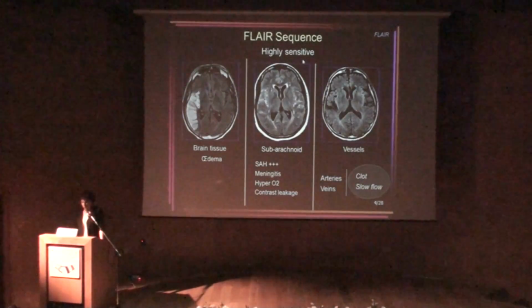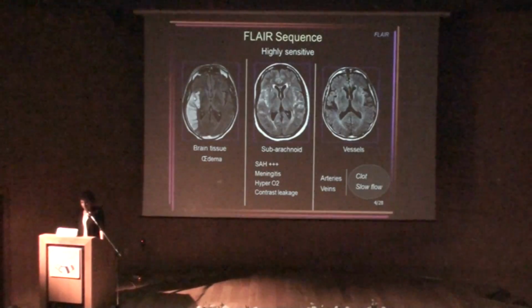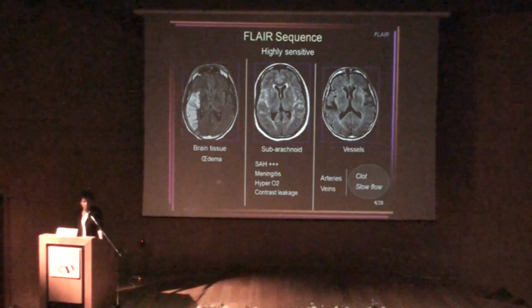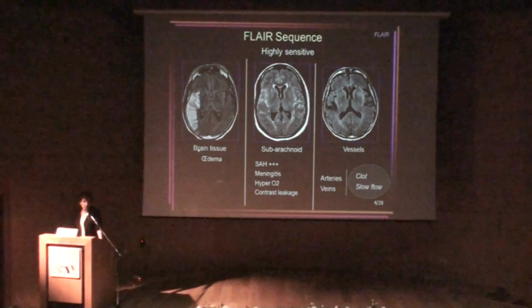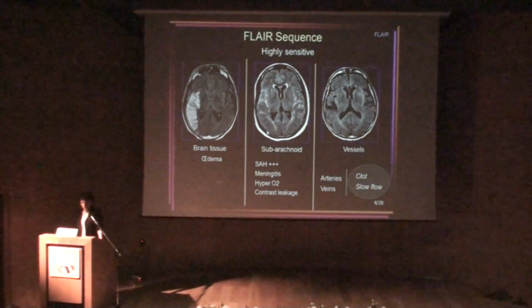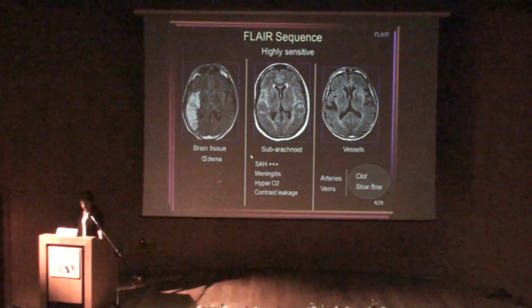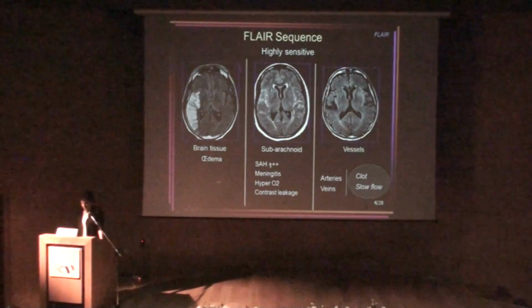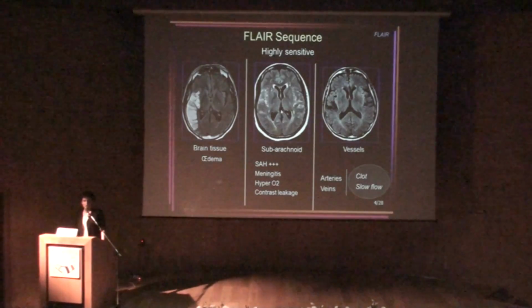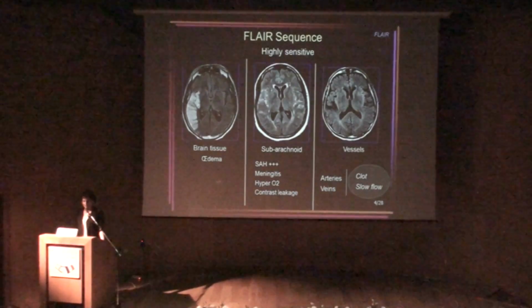So as you all know, the FLAIR sequence is exquisitely sensitive to everything. That starts with the edema in the brain tissue, and here is an illustration of the cytotoxic or intracellular edema that we see in acute ischemic stroke. It's also highly sensitive to any changes in the CSF content, and that's how we diagnose subarachnoid hemorrhage. Here is an example. So that's the first thing, but anything that will change the content of the CSF will result in a failure to suppress the signal of the CSF.